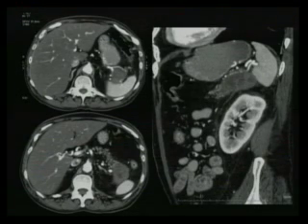They requested a CTA to rule out aortic dissection, and it showed this. The patient was asymptomatic at that time, until he went to the parking lot. We saw this, we informed this mass, and they requested a biopsy.